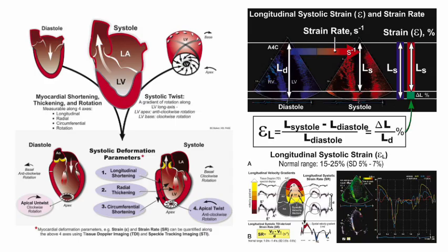So we have to think beyond volumes. We have to think beyond measuring the cavity. We have to really look into the LV wall itself to understand what systolic function is, and that's why we do strain. So what is strain? Strain basically is take any point in the LV, and how much that point moves over time. The good thing is we are using a machine, so the machine can take many points, and then it just calculates all that movement in one go. The thing with LV movement is there are many ways that the LV moves. How does that LV move?